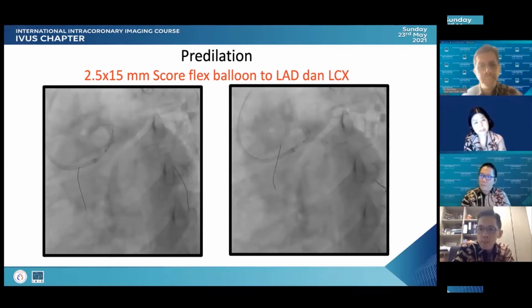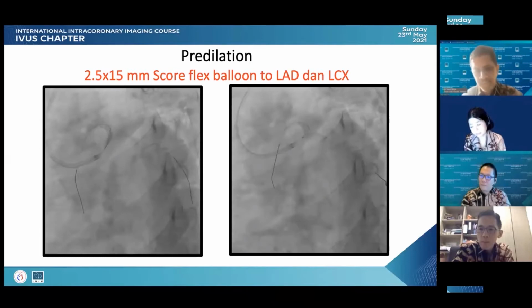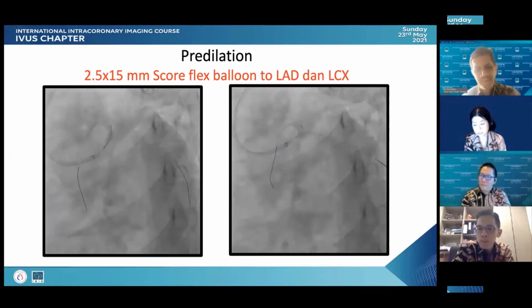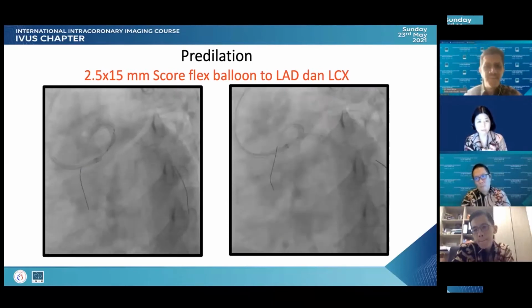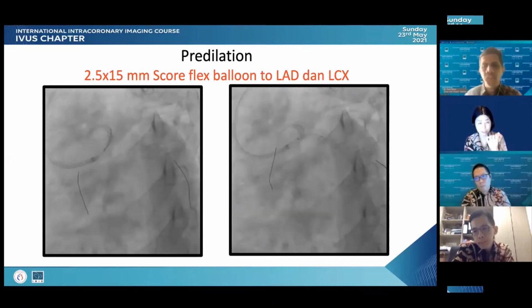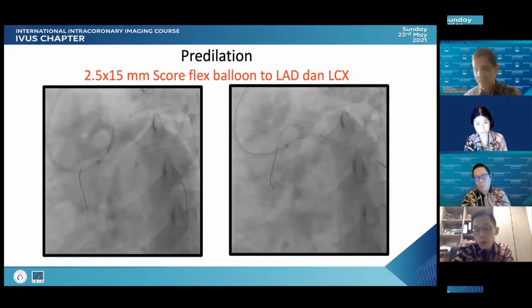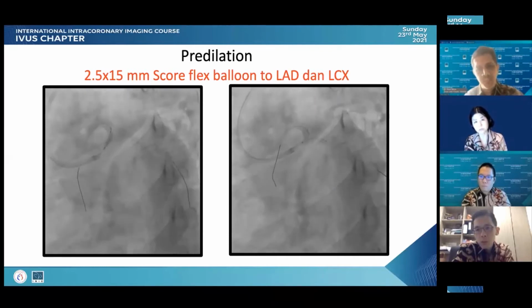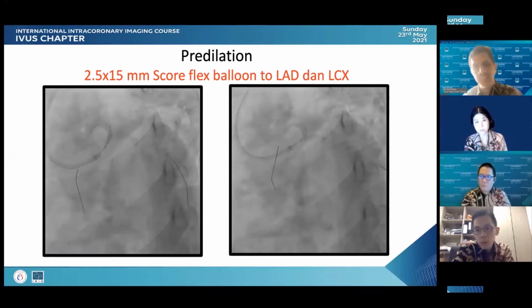Actually, the calcified nodule acute stent expansion was not too bad, but a recent paper shows that even with good stent expansion at the end of the procedure, you may have a poor outcome if there is a calcified nodule. When we look into the follow-up IVUS and OCT, the calcified nodule is reprotruding through the stent slot or causing fracture. I believe the calcified nodule is due to fracture of the calcium, and it always happens at the bending portion of the artery.